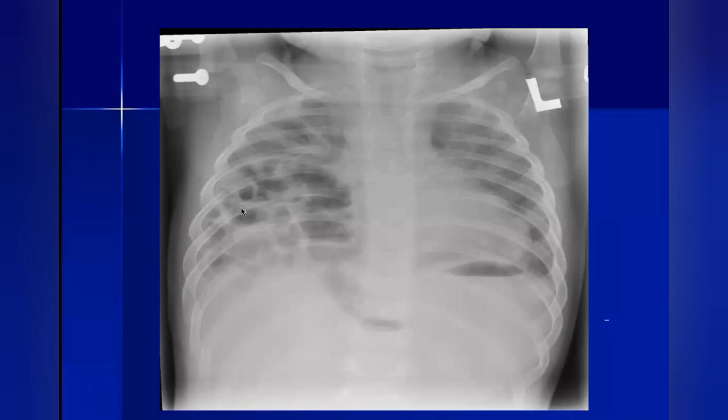Okay, and you didn't appreciate lung tissue on the right side, only maybe the upper part of the right lung is appreciated or compressed. So what do they call this type of hernia? Sir, Morgagni, on the anterior right side, which is more prominent there. Morgagni type of congenital diaphragmatic hernia, sir. If it's on the left side, what do they call it? Bochdalek hernia, sir.